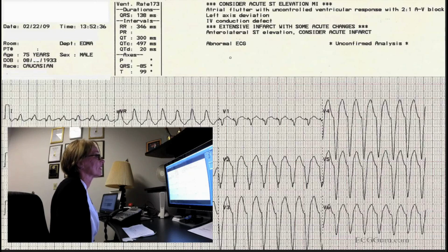There are many of those ECG features that we could talk about, but I'm not going to go into all of them that I know. I am going to show you some that I think will help you, the ones that are practical and easy to remember. And when you're looking at a wide complex tachycardia, they can really help you quickly decide that you're dealing with a VTach. First thing I wanted to point out is that multiple leads are very helpful.